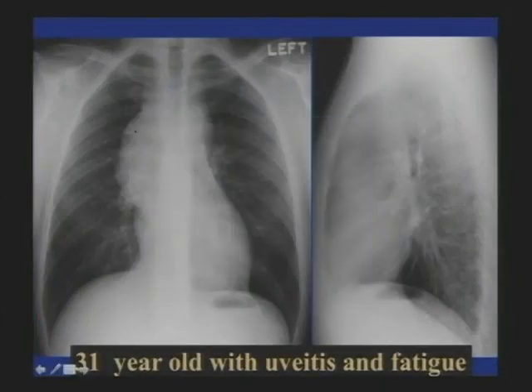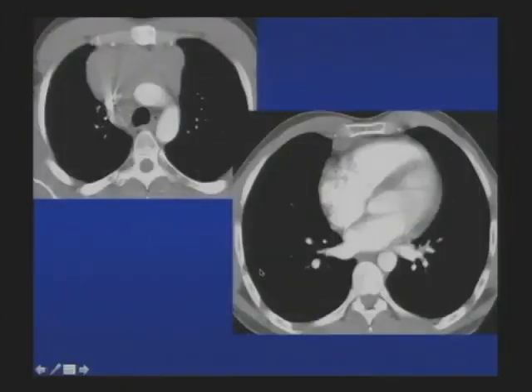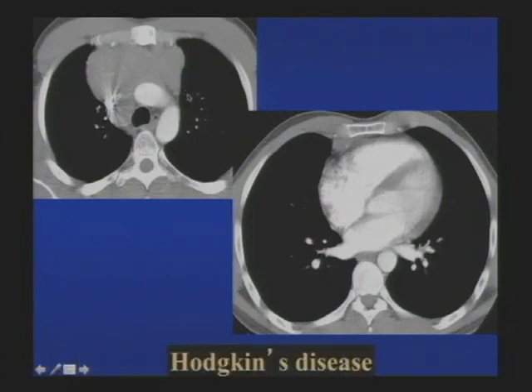Another example of a primarily anterior mediastinal mass. It looks like it is obscuring portions of the right heart border. The right paratracheal stripe looks like it's involved, so mostly anterior mediastinal mass. History would, I don't know, it probably would have led me towards sarcoid, but this also can be seen. Very infiltrative appearing, not like a nice solid round tumor, it's more infiltrative appearing. And this is a case of lymphoma.